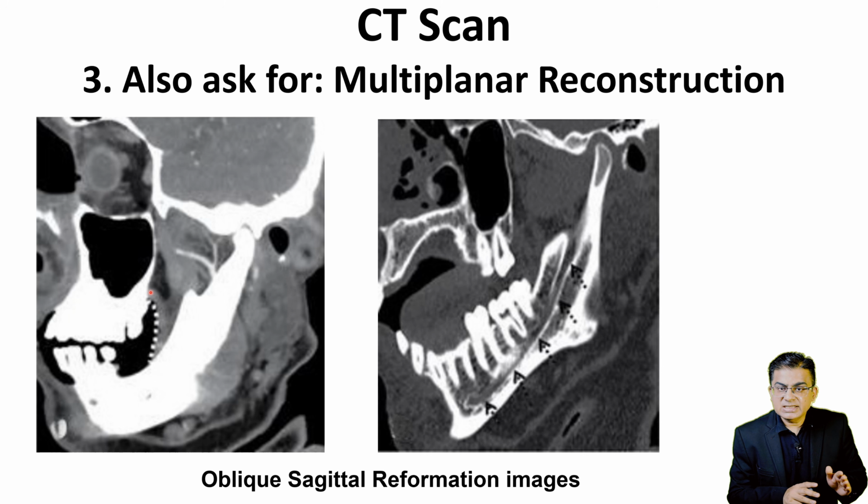See, this is another oblique sagittal reformation. It shows the entire extent of the inferior alveolar canal, as shown by the dashed black arrow, in the body of the mandible. It starts from the lingual side of the mandibular ramus at the mandibular foramen, continues on the buccal aspect of the body of the mandible and ends at the mental foramen adjacent to the second mandibular premolar tooth.